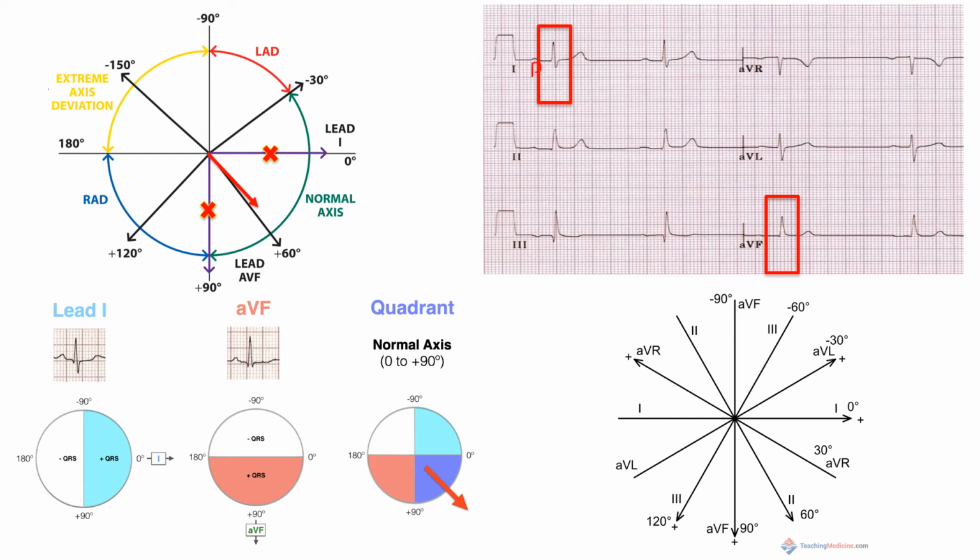You can see that right here you have your P wave, here is your R, right here you have your S, and right here you have your T. Of course, right about here, it's just going to be hard for me to write it, you have your Q. So your PQRST waves right there.